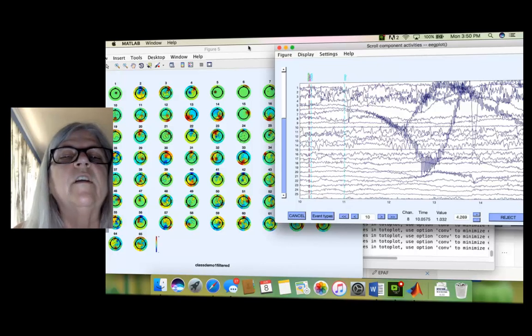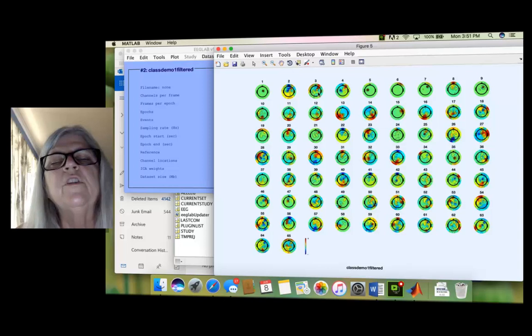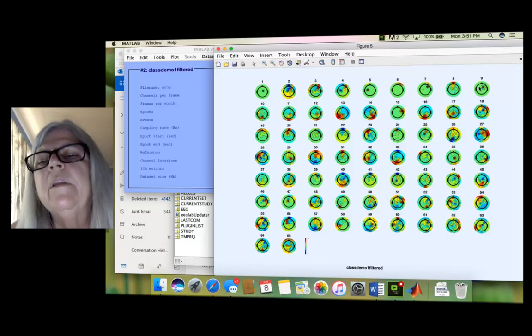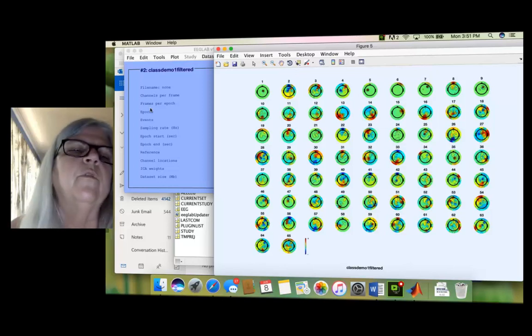So I'm just going to walk you through what, if we look only at these plots, I'm going to say that 1, 5, 6, 7, probably 9, and let's pick another one. Maybe 24. So what was it? 1, 5, 6, 7, 9, and 24.